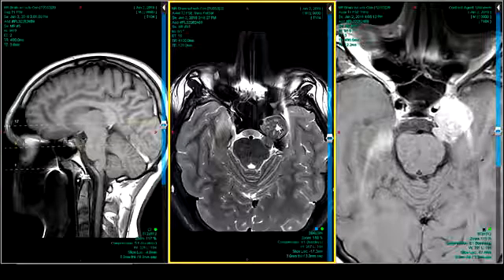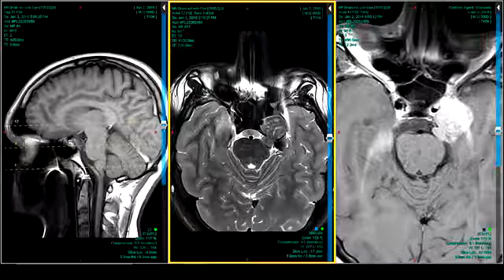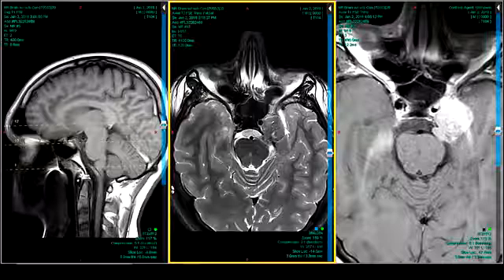Now, schwannomas and meningiomas overlap quite a bit, so you can't use signal by itself to decide between the two, but if you average, all schwannomas versus meningiomas are lower. There is such a thing as a cystic meningioma, and we've seen meningiomas with big cystic caps on top of them, so they can kind of do whatever the heck they want.